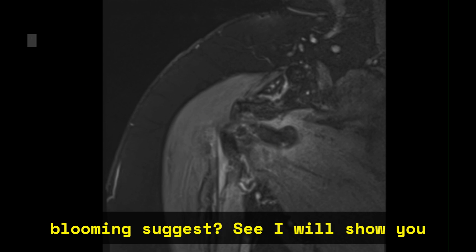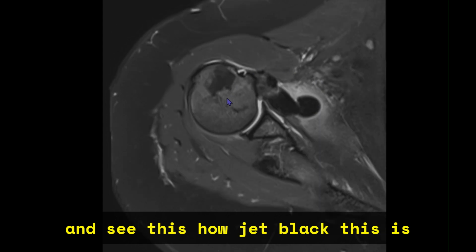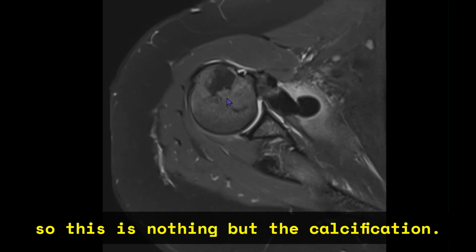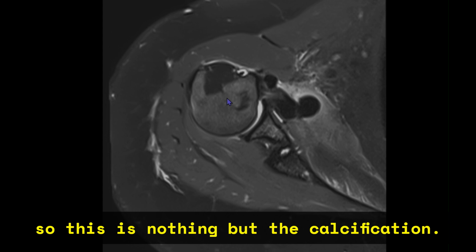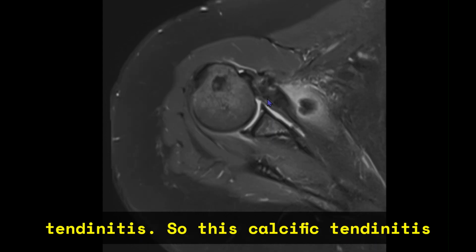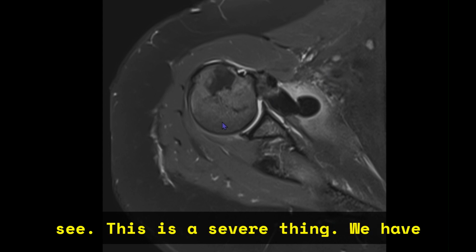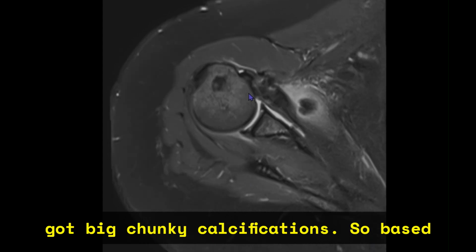See, I'll show you once again on the axial PDFS images, and see how jet black this is. So this is nothing but the calcification. So this is a type of calcific tendinitis. So this calcific tendinitis is, however, not the routine type that we see. This is a severe thing. We have got big chunky calcifications.